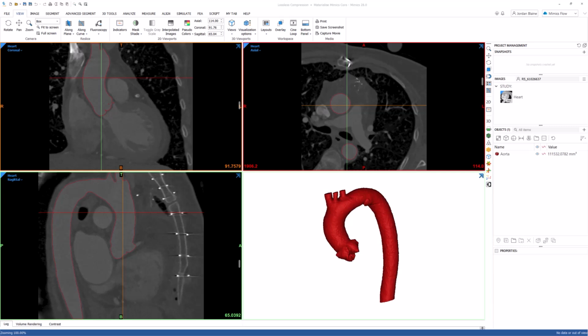The centerline tool calculates the central path through a tubular anatomy. You can measure geometric properties along the line, visualize branching patterns, and export these measurements for further analysis. This tool is commonly used in cardiovascular and pulmonary applications, but it works for any solid anatomical part that has a tubular morphology. For our example, we'll use an aorta model created from segmenting the blood volume within the artery.